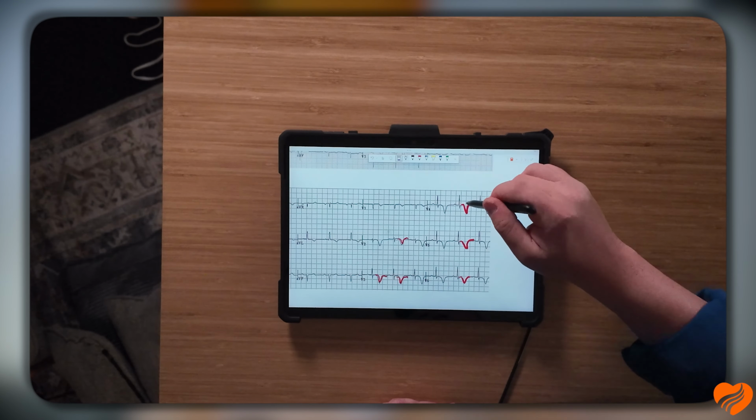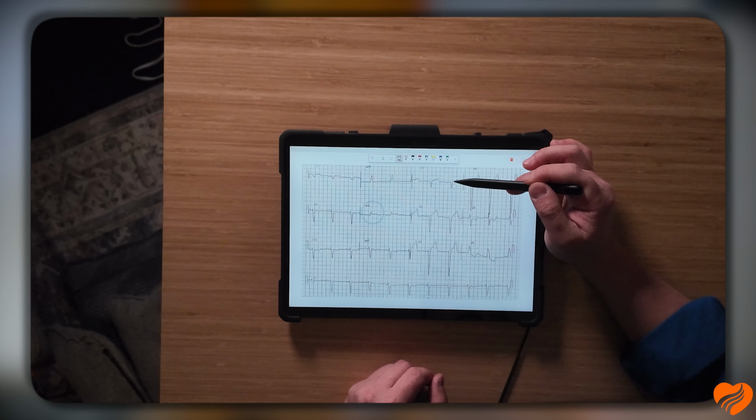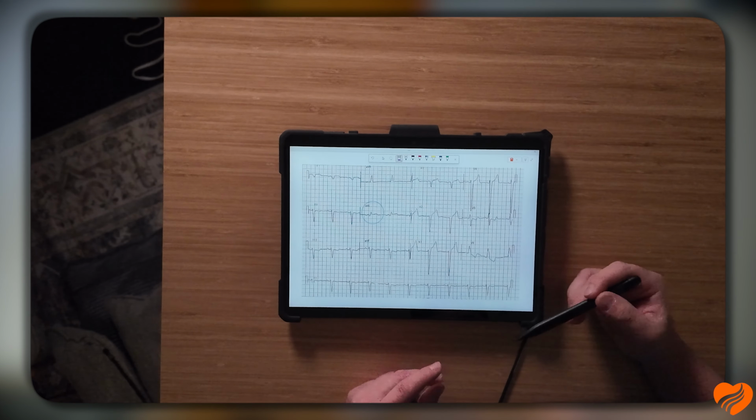Pretty. Alrighty, now let's go ahead and look at some OMIs regarding left bundle branch block and paced rhythms. So here we've got a 12 lead. QRS is kind of wide, right? Let's see here. Looks like 1, 2, 3, 3 small boxes. And using the turn signal method, you start at the J point, and then the QRS goes down or negative. That'll be a left bundle branch block, right?